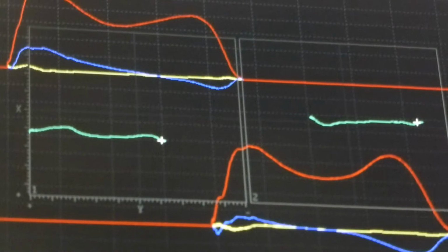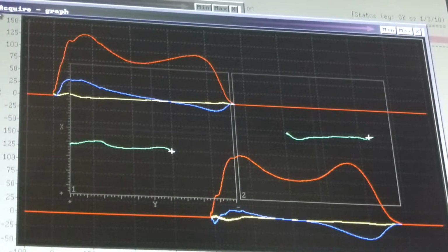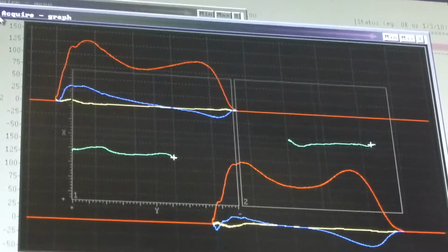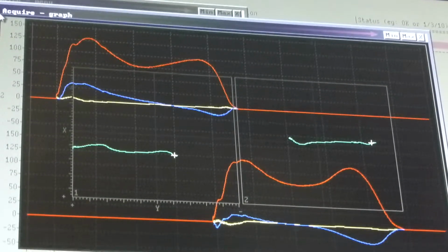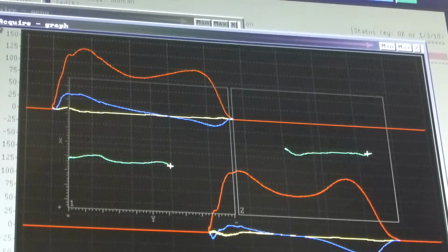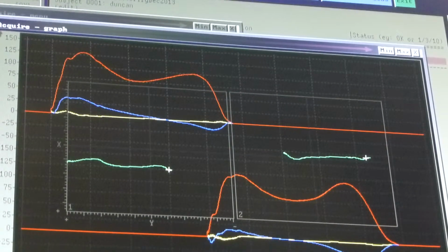Okay, right. And this is the first graph that comes up when you do acquisitions. One of the things you can look for is how close to the edge was that strike. Is it close enough that you're worried about it? It's another indication that maybe you shouldn't save this trial. If it's anywhere on the force plate, it's all right. Okay. And just tell me what the X and then the green line means.